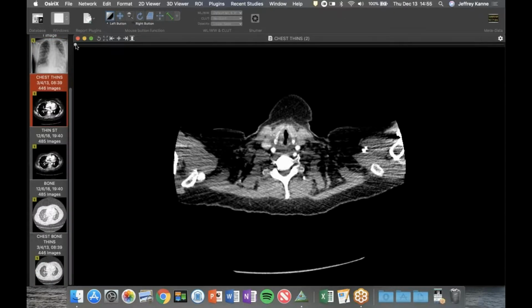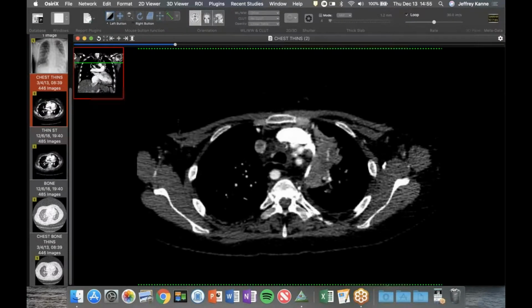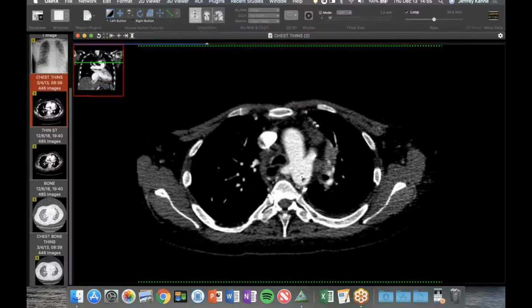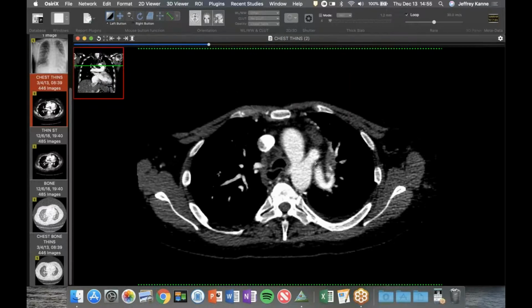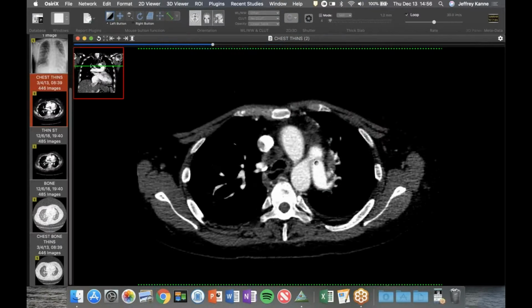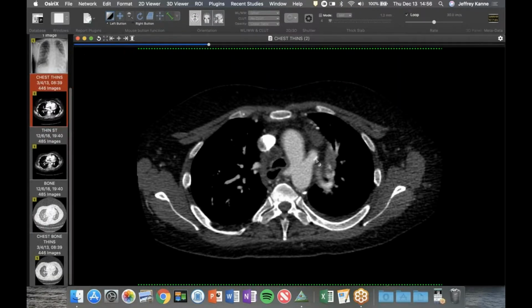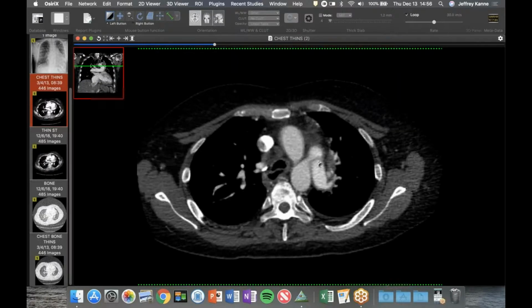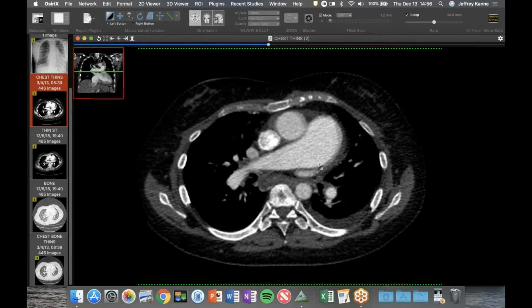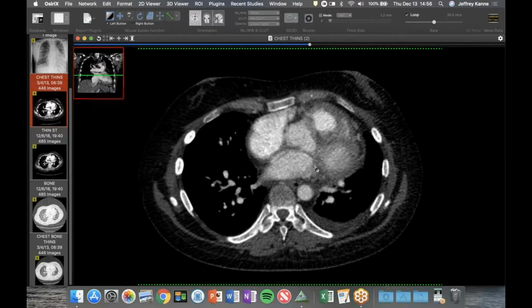She has had a history of a couple of infections, but what I want to show are some of the congenital anomalies. So ignore the consolidation. We've got an aberrant subclavian, which is not particularly interesting, but this is cool. You've got this vessel connecting the aortic arch or the aortic isthmus with the pulmonary artery. So a nice patent ductus. And I know David always likes to point out the atherosclerosis in it, from high pressures for long periods of time. And we've got severe pulmonary hypertension. She's got Eisenmenger physiology.